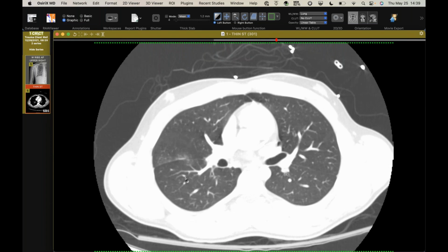I think you see it more when you have a lateral force and the lung rapidly accelerates and then decelerates, and often you'll get a quick mediastinal rotation. If the force were coming this way and the compressed left lung were to re-expand rapidly, it can cause a laceration there.